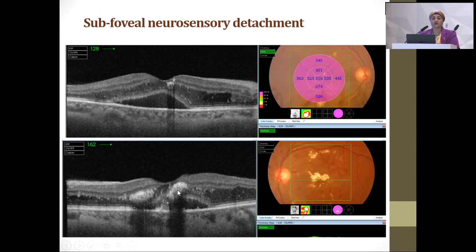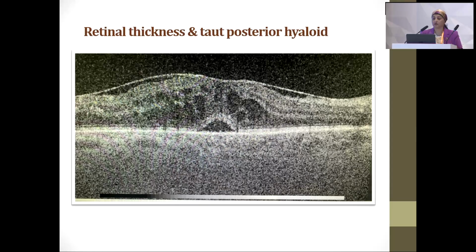But here, in this case, there are high reflective deposits in the intraretinal spaces of high exudation, as we can see corresponding in the color photography. And this, of course, carries worse prognosis than the upper example, but here the reflectivity and the thickness of the vascular index of the choroid is good, so it's a better prognosis in the upper photo than in the lower photo.